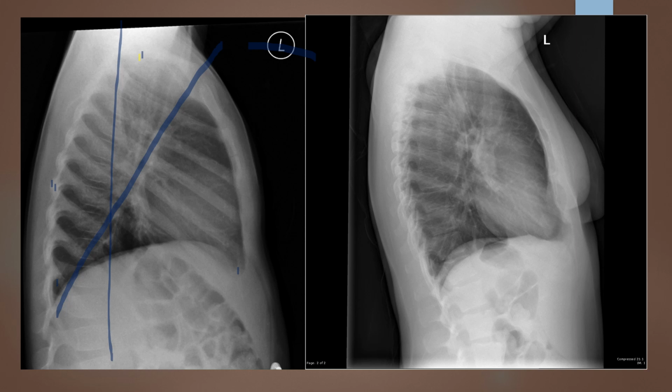Then we have to think about our mid-sagittal tilt. Mid-sagittal tilt, we are expecting to see the 2 diaphragms superimpose within a 1/2 inch of each other, and here they are superimposing, indicating that there was no significant mid-sagittal tilt. And then we see up here, no chin in the image. We see arms out of the way, no humeral soft tissue covering the lung field, so everything looks good there.